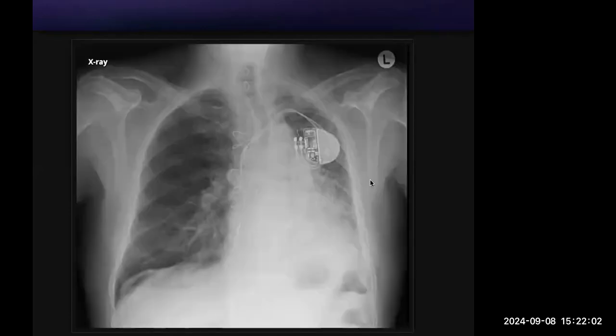Okay. This is your next case, last case. So presented with the frontal radiograph of chest of a skeletally mature patient, I can see a pacemaker wire in situ, which is appropriately positioned.